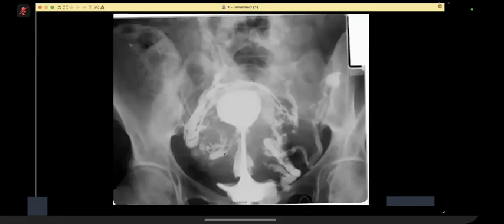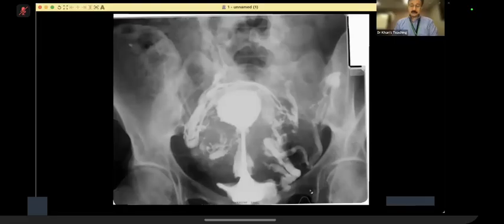No. It's not the usual appearance. Yes. Then I feel that there is some fistula here in this exam. The veins, doctor? Say again. Is it these veins? Veins.